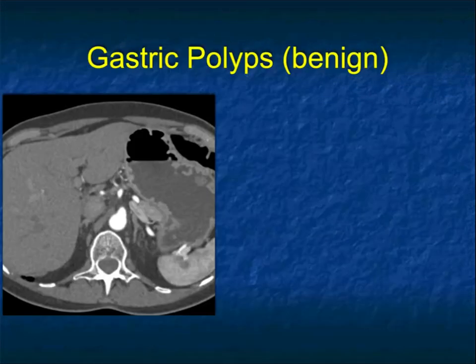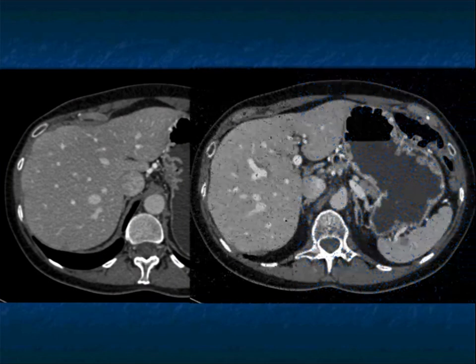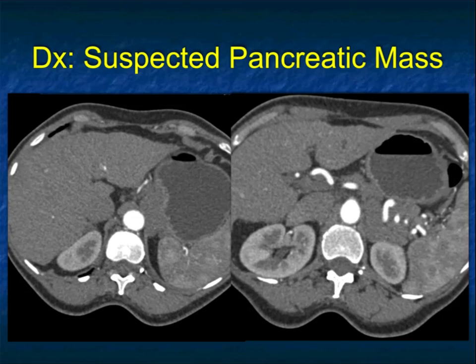In this patient, if you had given oral contrast, you would have seen the patient has hundreds of polyps. Now, the patient wasn't given oral contrast because they were getting an ERCP, so we couldn't look at the stomach. But when you looked at the stomach, the patient had hundreds of benign polyps. Look how easy it is to see, but if you don't give the water for distension, here it is again, you're not going to make that diagnosis. Again, technique drives your accuracy.